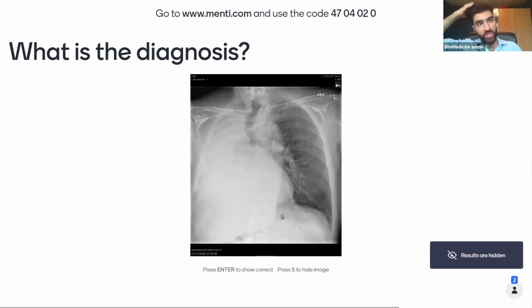Could the previous X-ray be a hemothorax? It could be, yeah. So a pleural effusion encompasses all of those things: blood, liquid, lymph, etc. But hemothoraxes and chylothoraxes are obviously slightly less common. And if the patient hasn't had a history of trauma or bleeding, you wouldn't really suspect it.